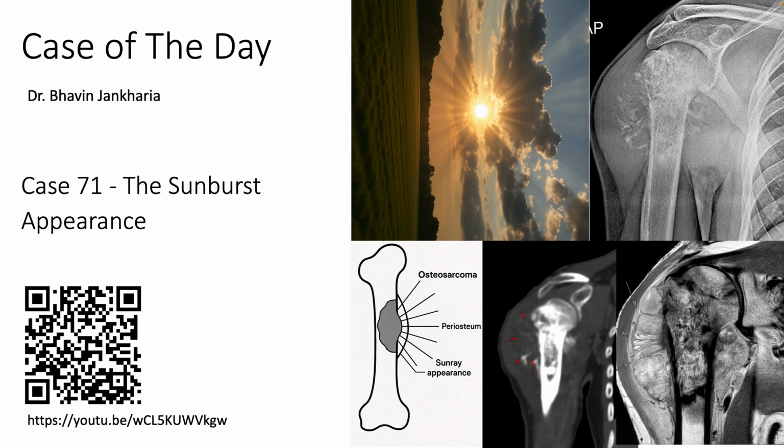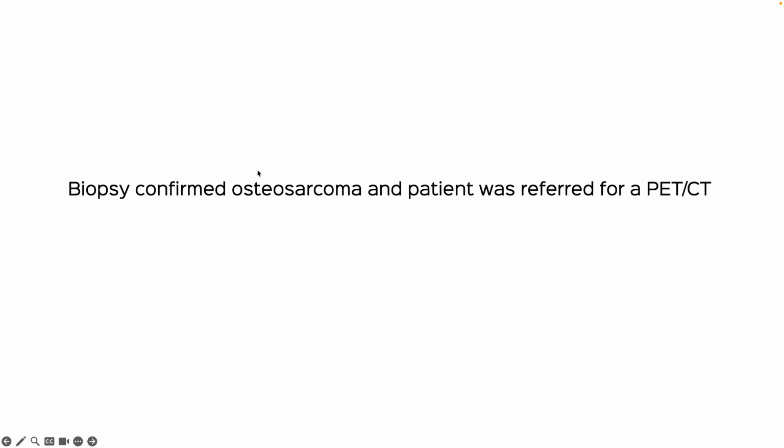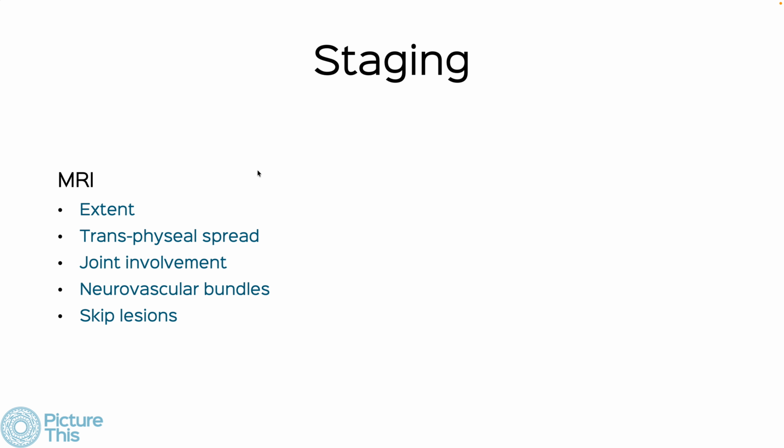This is only for those who find all this extremely interesting and intriguing, because I kind of went down a bit of a rabbit hole in this. So anyway, biopsy confirmed OGS, patient was referred for a PET CT.